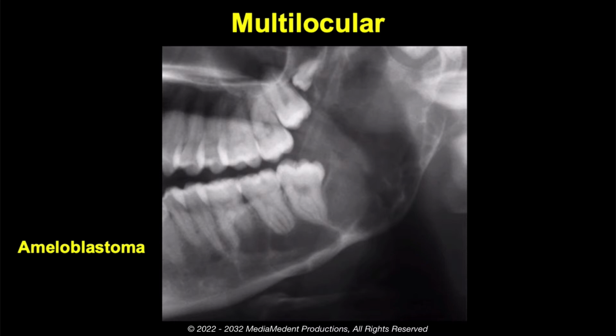It may cause migration and loosening of teeth with root resorption. The ameloblastoma may expand and thin the cortical plates. Frequently, it erodes the cortical plates to invade soft tissue. Radiographically, it may present as a well-defined and frequently multilocular radiolucency that is either soap bubble-like or honeycomb in appearance, or a corticated unilocular cyst-like radiolucency. Lesions in the mandible tend to have a multilocular appearance, while those in the maxilla are more commonly unicystic with more ill-defined borders.